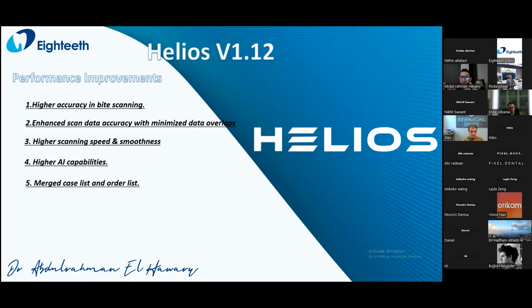Also, this is just an enhanced user experience within the software. It used to make the software not as smooth as possible. It wasn't really understandable for most clients.